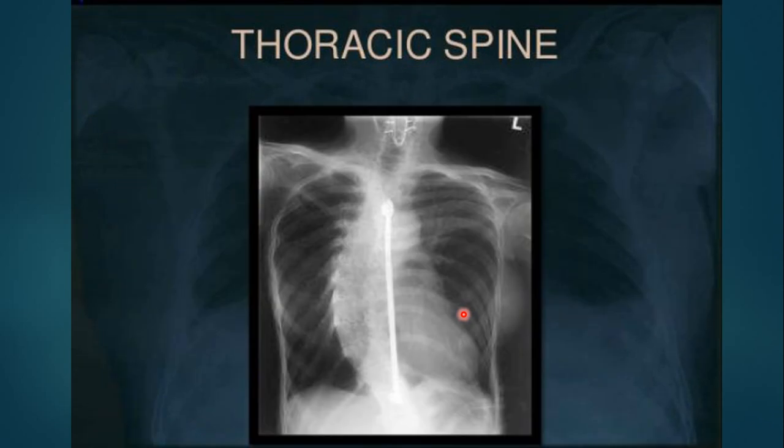For example, what do you see here? You can see evidence of scoliosis, convex to the right side of the dorsal vertebrae, and there is evidence of some sort of surgery done for this patient. And you need, of course, to evaluate the lateral chest X-ray for further evaluation of whether there is any segmentation or fusion abnormalities.